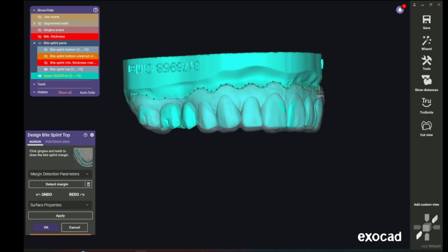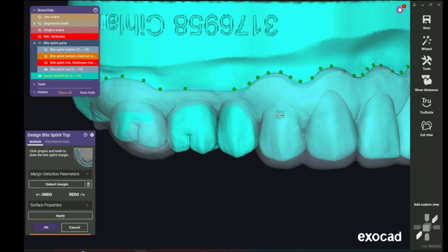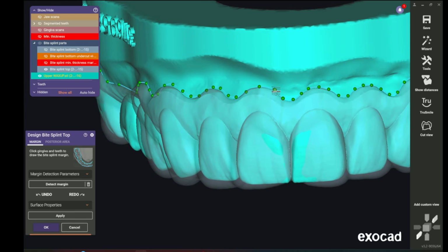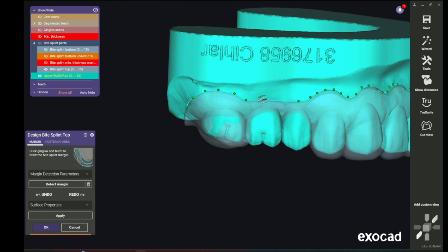But we're going to go all the way around, and as you can see, here's my pre-op. This is where the doctor's going to do the gingivectomy, but we also have to add 3 millimeters where our pre-op is, because this will help with the healing process, and we can have good, healthy gum tissue grow back.